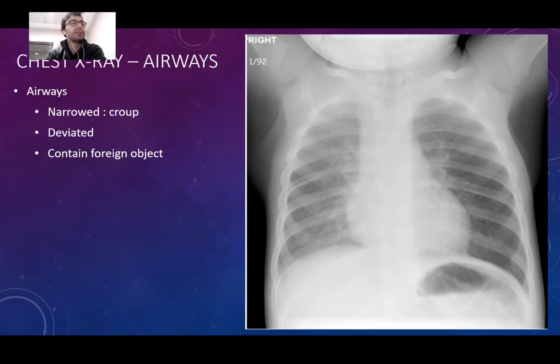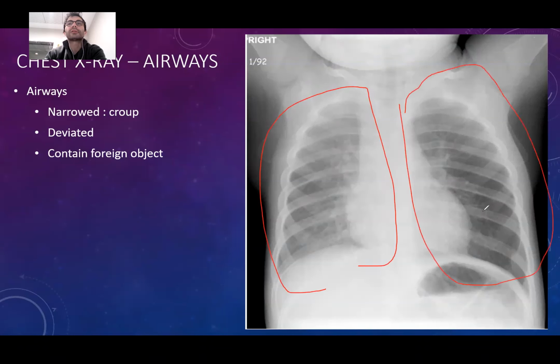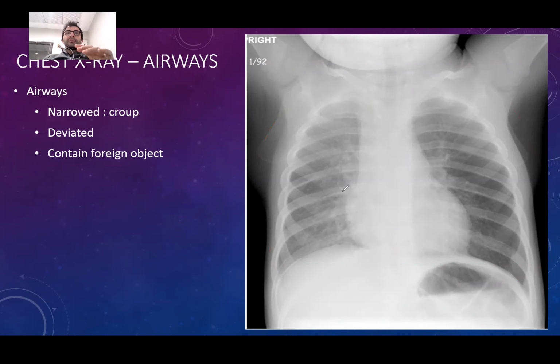Can anybody see any abnormality in this image? This is very important. This is something you should always be looking for in general practice. When I look at the lung densities, the density of the left lung is markedly decreased compared to the right one. So there is big asymmetry in this area. Either there is something which is increasing the density on one side, or something which is decreasing the density on the other. In this patient, it was foreign body aspiration.